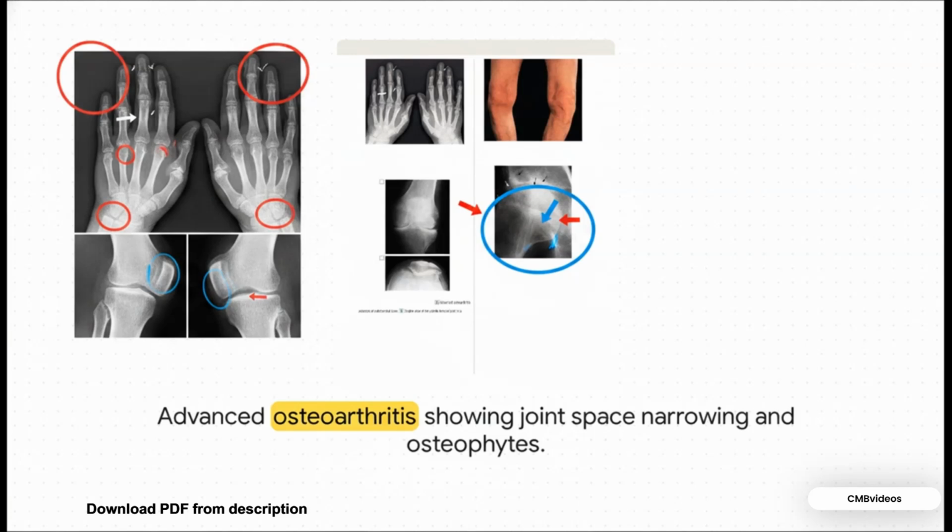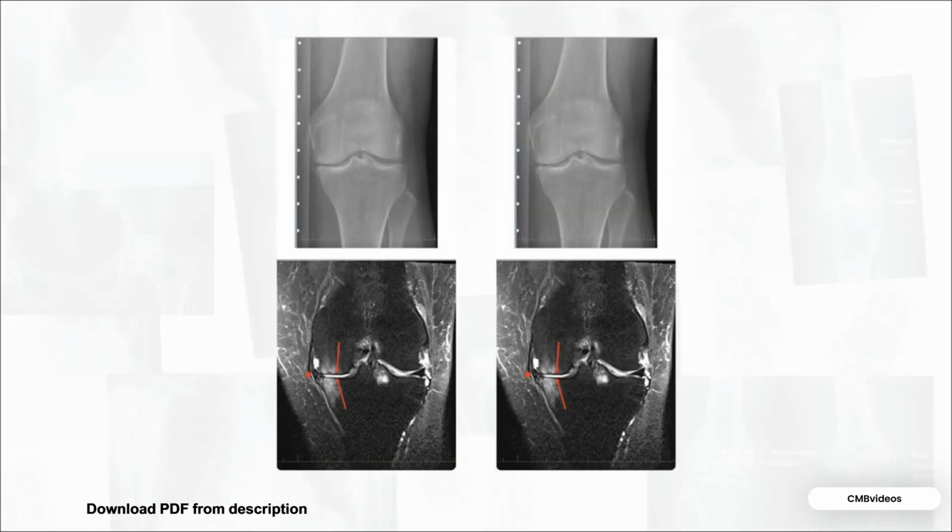proximal interphalangeal joints. And this comparison is just a brilliant illustration of how our imaging tools work together. The plain x-ray shows us that telltale medial joint space narrowing and a few bony spurs, right? So we strongly suspect the cartilage is gone. But then the MRI confirms it. It shows a complete denuded loss of cartilage right down to the bare bone in that exact same spot. The x-ray gives us the structural shadow, while the MRI reveals the undeniable soft tissue reality.